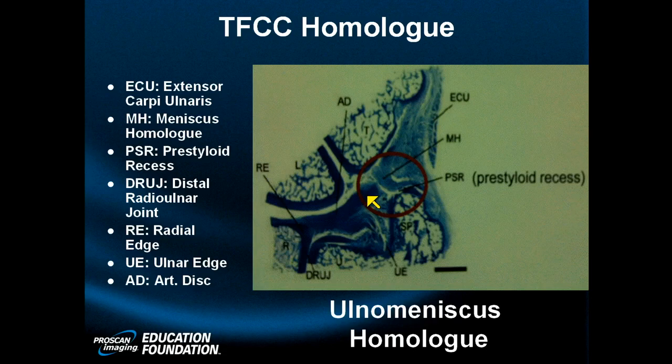These are known as the set of volar and dorsal ulnocarpal ligaments. So in the front, what would these ligaments attach to? The volar radial ulnar ligament. In the back, what would they attach to? The dorsal radial ulnar ligament.